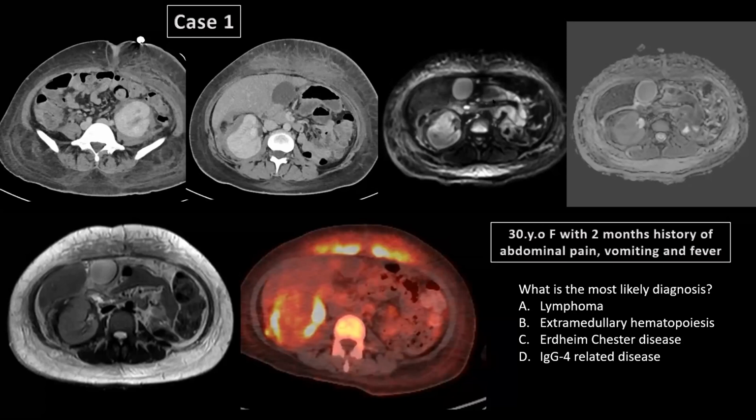So let's discuss what the imaging features are in our case. First, we have the CT images showing bilateral perinephric soft tissue involvement, or soft tissue ring-like densities with interposing fat in between. These soft tissue densities show low T2 signal intensity, and they don't demonstrate diffusion restriction. We have an additional finding, which is the anterior abdominal wall soft tissue density or thickening, which is also showing hypermetabolism in the PET-CT, similar to the perinephric soft tissue. So it's an actual soft tissue lesion or abnormality involving the anterior abdominal wall.